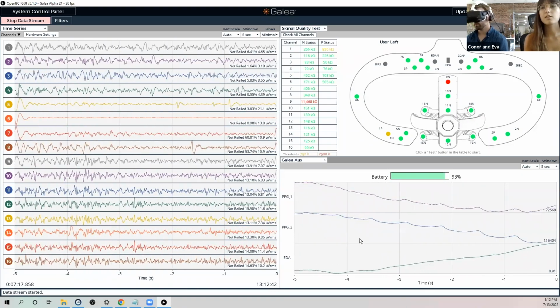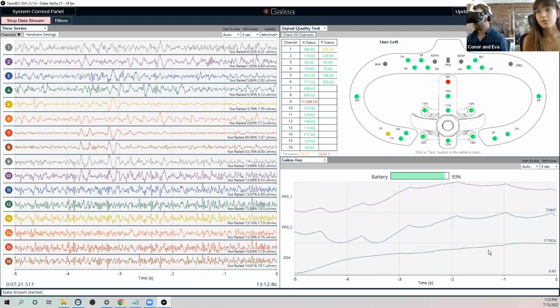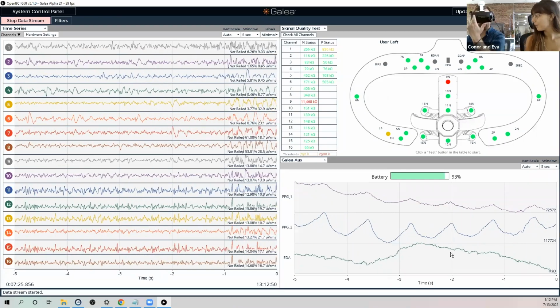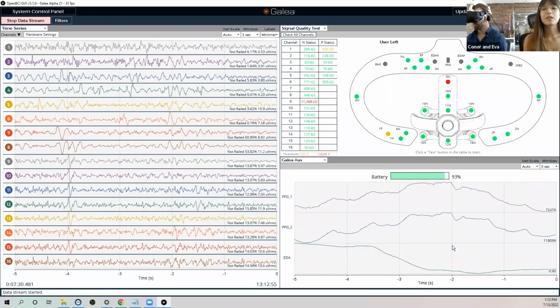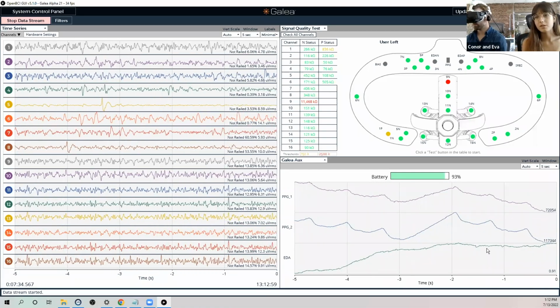Yeah, it looks like it's still going up, but we will probably see it stabilize over the next few minutes. Yep. I mean, it's actually getting better. I can feel it. Like I can feel the sweat on my brow. So. Cool. Okay, cool. So maybe we can test the pinching later once it's stable.